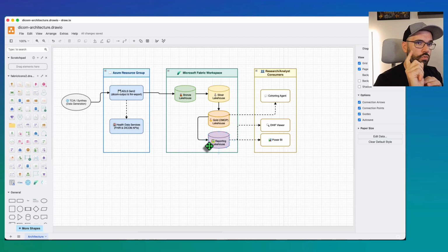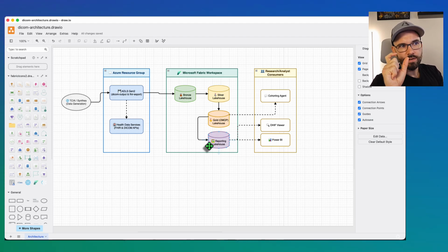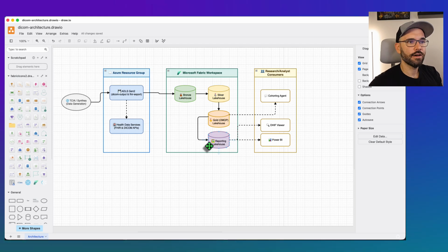One quick thing that this deploys is a viewer to help you see those particular images to understand, oh yeah, those are patients with x-rays or MRIs or whatever. So the next part, we will go through Fabric and look at all the stuff that was deployed as part of the entire DICOM imaging footprint.